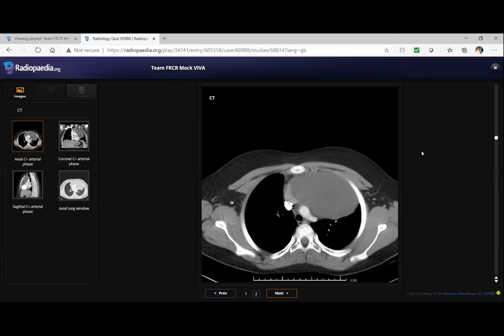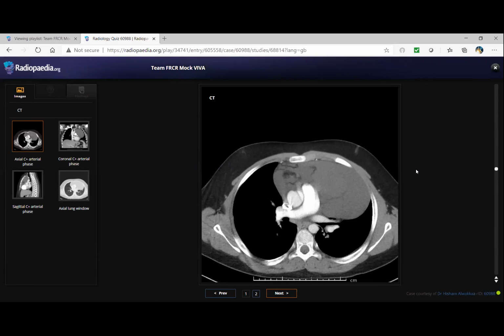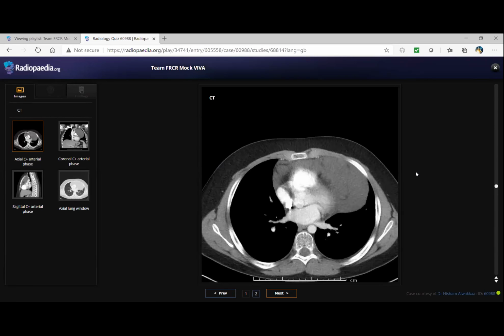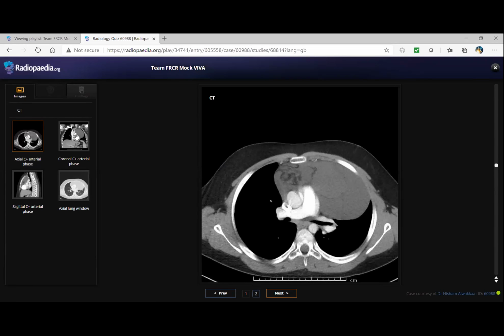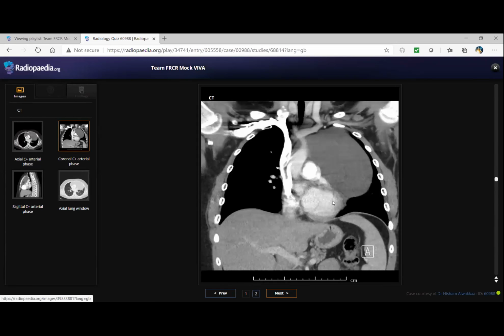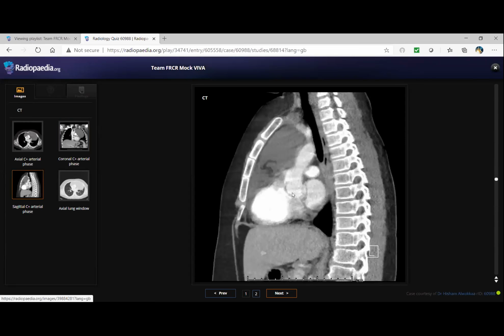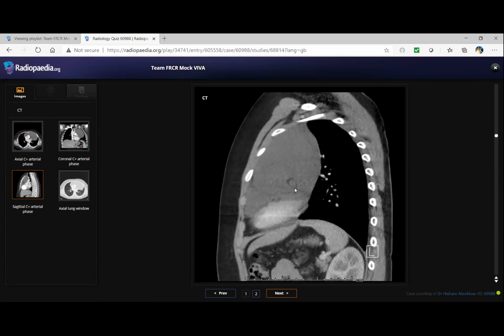So the findings in the X-ray are confirmed in this CT, with a hypodense, non-enhancing lesion in the anterior mediastinum that is encasing the heart and causing mass effect, but there are no signs of any invasion or any aggressive features. I'm not seeing any calcification, no fat component. I'm also looking at any extension into the neck, and in the coronal view, that's not coming from the neck.